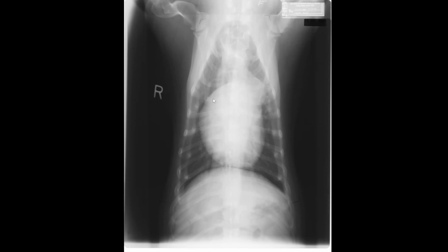So in a young dog, big right heart, big bulge of the main pulmonary artery segment, and he's got a murmur. Okay. Most of these dogs clinically, they will pass out. So they'll be running around for 3 or 4 minutes, and suddenly they just quit, and sometimes they'll just completely pass out and they recover. But that's because they can't get enough oxygen to their lungs because of this occlusion of the blood trying to get to the lungs. Okay.